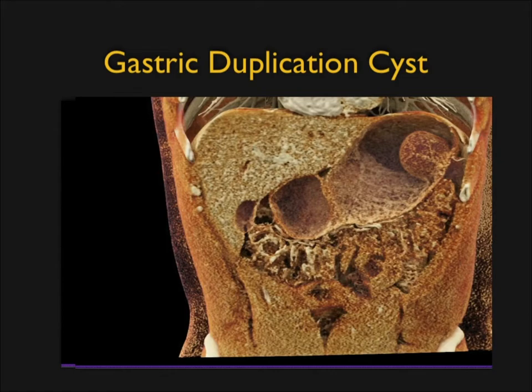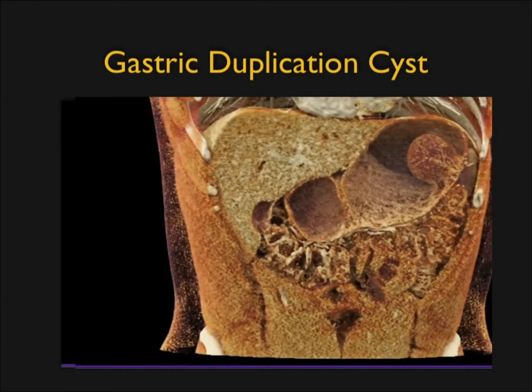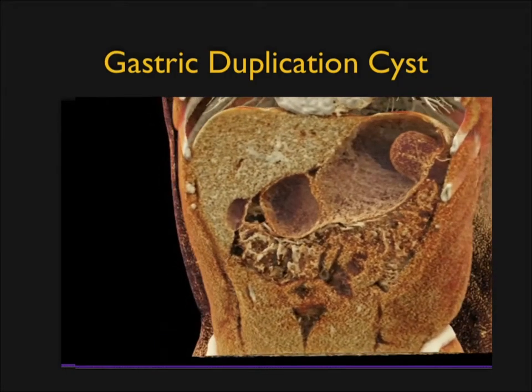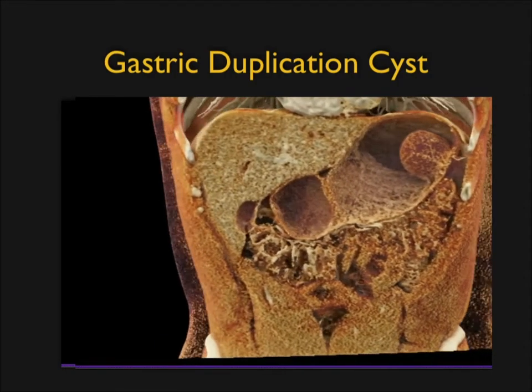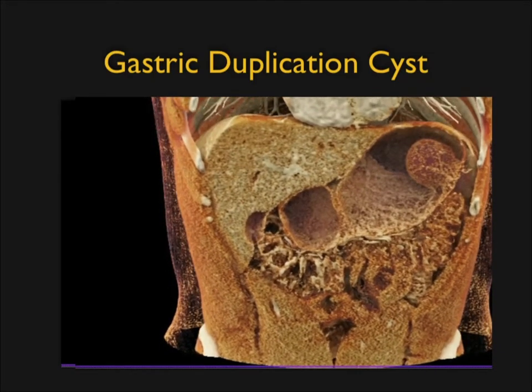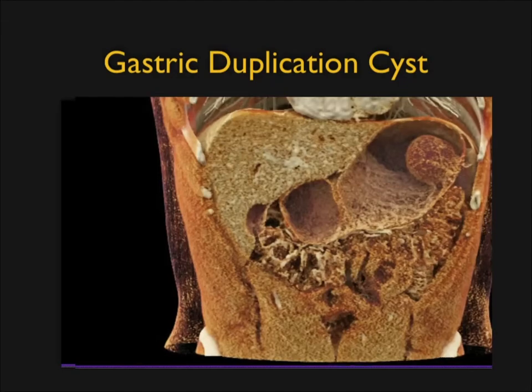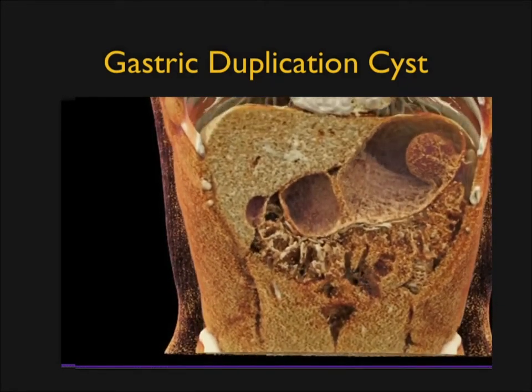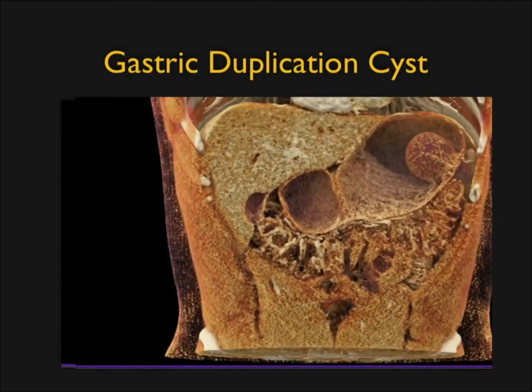And you can see from the videos here that on these 2 sets of videos we're able to show specifically what we want to see. I like the interactivity because interactivity in general gives me an infinite number of pictures. And I think we should be able to send videos to the referring docs because it would make them get a feel. It's kind of like giving them, this is an endoscopy of the stomach as far as I'm concerned.